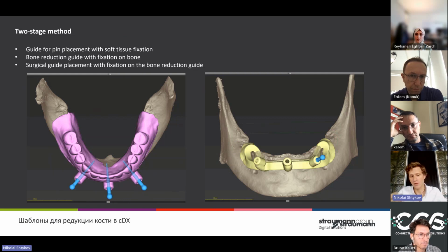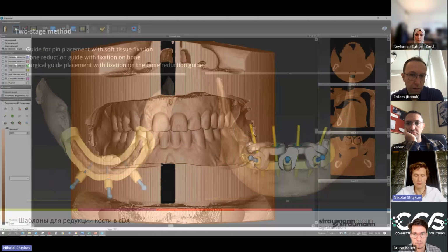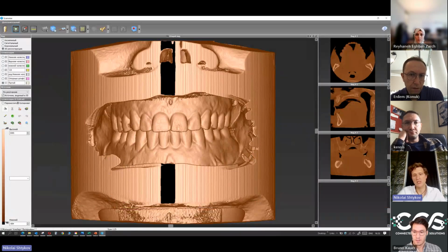And it's possible to use the next one. We can use the prosthetics, but sometimes it isn't used. Here you can see CBCT with prosthetics. The prosthetics is not X-ray contrasted, but if you look at the left down corner, you can see the contrast line in the field, and now you can see all the data.